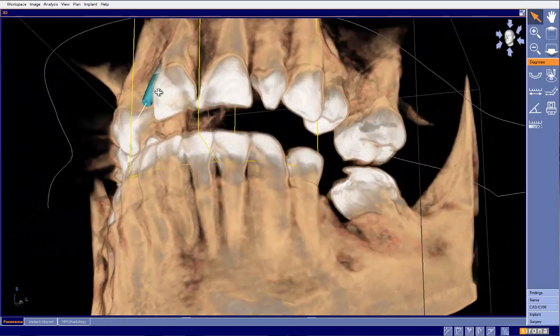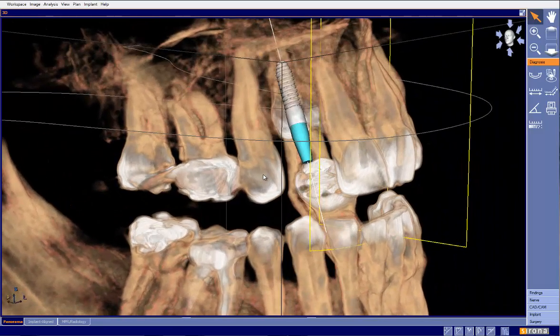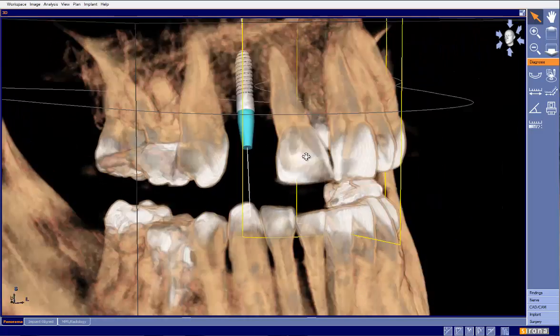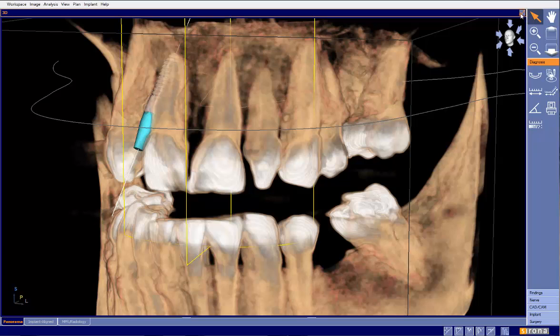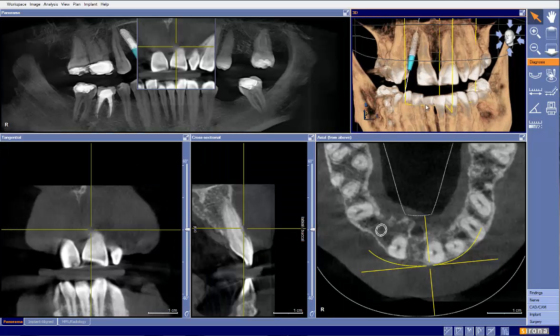So the closer I look at this, the more I'm pretty confident that this is actually missing two teeth. But again, I've been wrong many times before. Or if it's not missing two teeth, maybe this is number 6 and number 4 or 5 is missing. But aesthetically, I'm concerned about the size of that space right there. This is where having good CEREC data would be helpful diagnostically and aesthetically to determine that. Again, if the patient doesn't mind and the treating dentist doesn't mind, that's a different story.